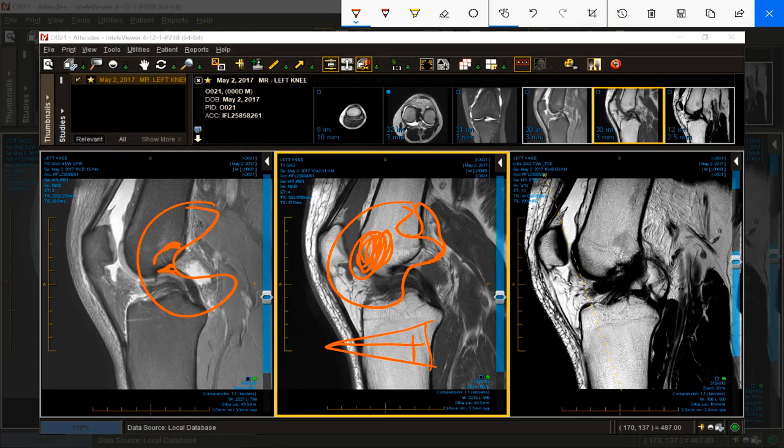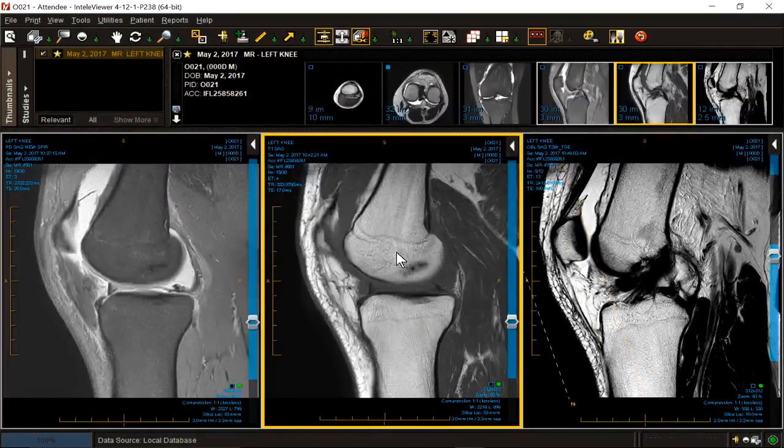If you've got a tear going this way, it's vertical. You hardly ever want to do anything to vertical tears unless they gap. If they're in the outer third, you almost never operate on them. You can also take menisci and separate them from attachments. And that will be a story for another case. So now let's continue scrolling.